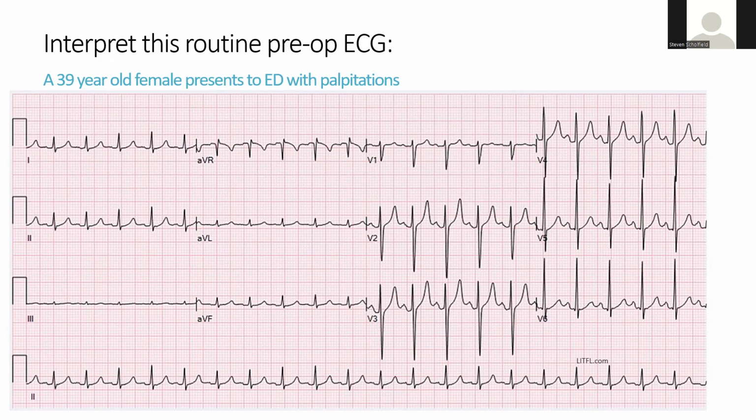And yeah, the sort of good R wave progression. So I mean, it looks like sinus tachy. Yeah, and you're right, absolutely. So this is basically an easy, very, this shouldn't all be hard at all, but this is just getting people to think about how to interpret it. You followed that process there to interpret an ECG.